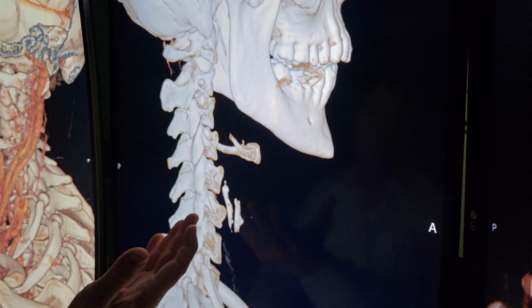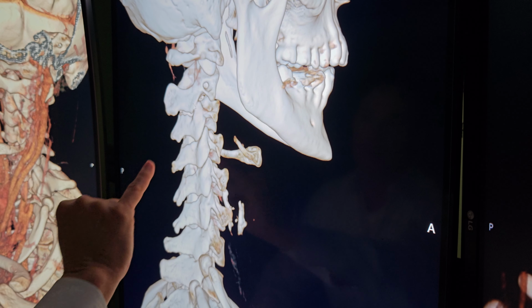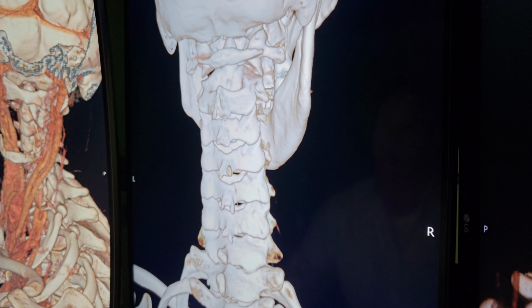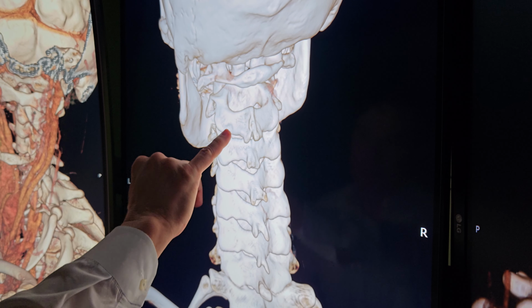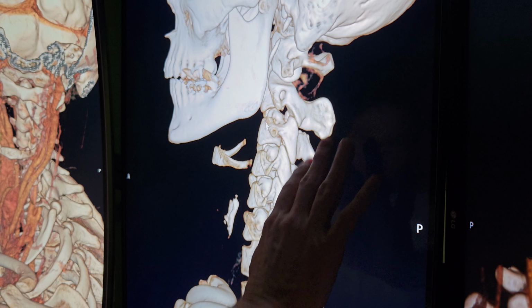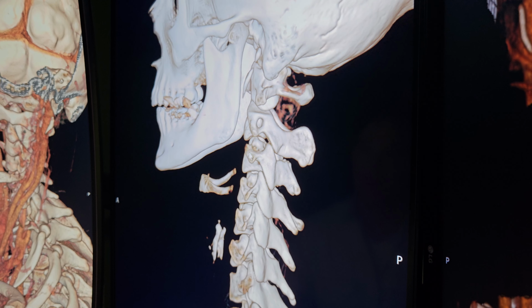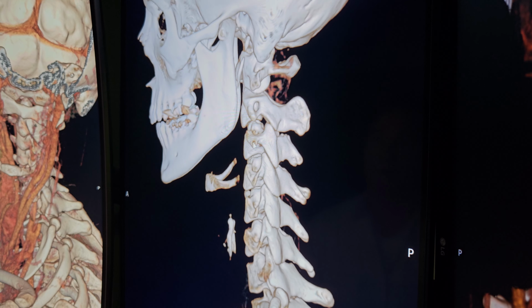Again, you're lying flat on a bed with no pillow here. I don't want to go into it too much, but this joint space is open and stuck in flexion, and we're finding it that way on both sides. You can see how telescoped forward that is. So we would want prolotherapy or something to stimulate the ligaments, to tighten up the ligament structure in the cranial, upper cervical spine, posterior elements there. Yeah, we have hypermobility all over the place.